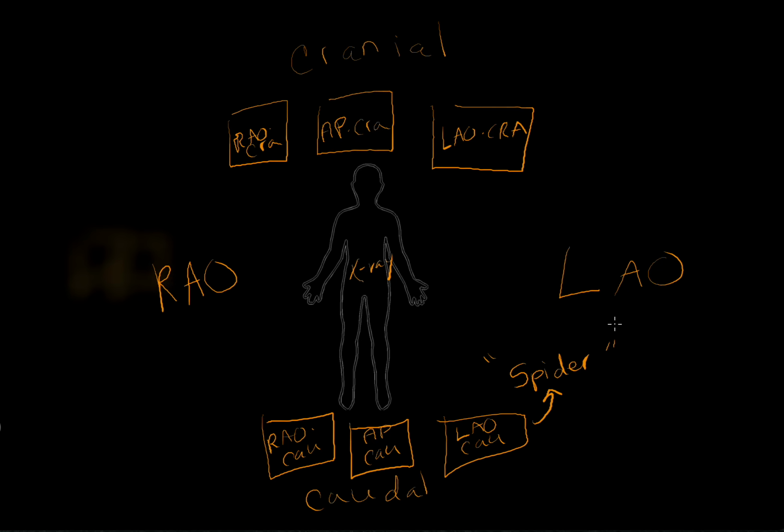Let's go over now what you can expect when looking at the cranial projections, and then we'll discuss what you should expect to see when looking at the caudal projections.